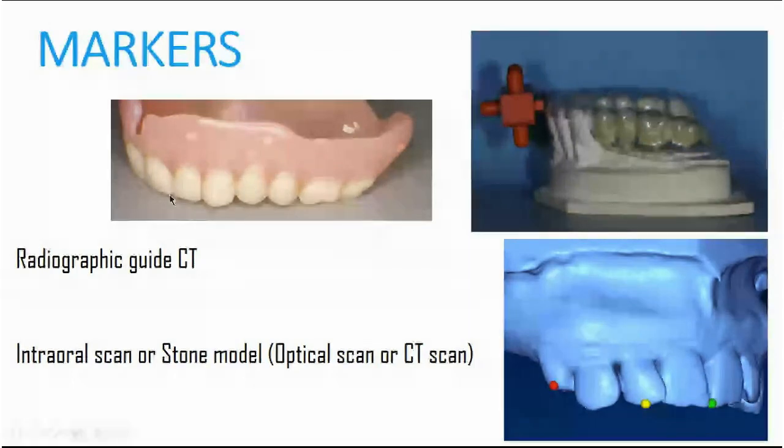These kind of markers are used when we have completely edentulous patients, when we would like to match the data.